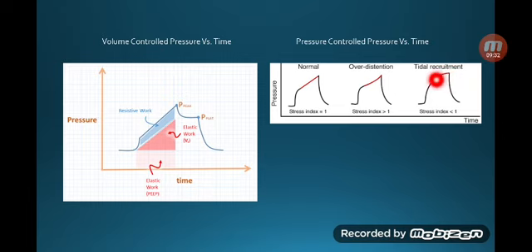which might mean that you're not inflating the lung fully. This is what you would expect if you're getting the right pressure. But again, because there's also inspiratory time, usually there is a bit of a plateau and then it goes down. If it's peaking like that, then you're causing barotrauma and volutrauma, which is overdistension. But if it's like a shark fin, then there's room for more pressure for the lung.